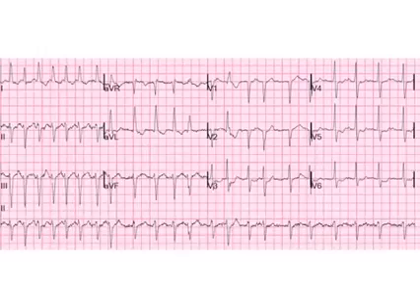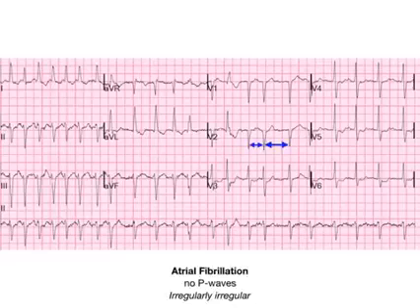What do you see here? This is a very, very high yield ECG, and it may not be obvious at first, but I want you to pause the video and look around and see if you can tell me what we are looking at on this ECG. This is atrial fibrillation, and almost equally as high yield as STEMI, if not more.